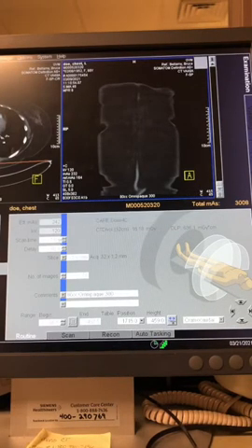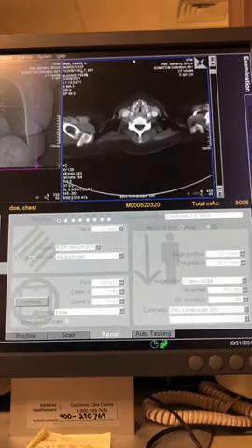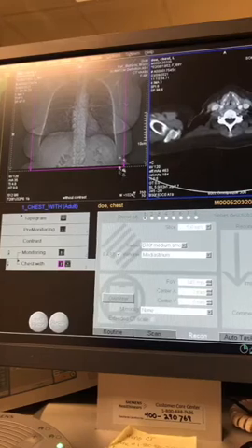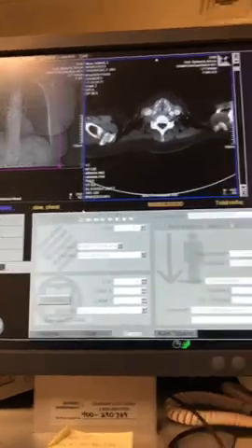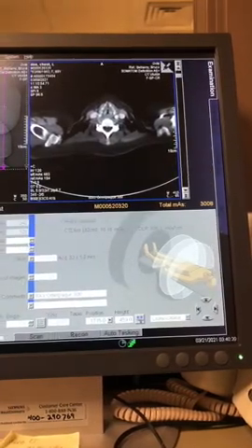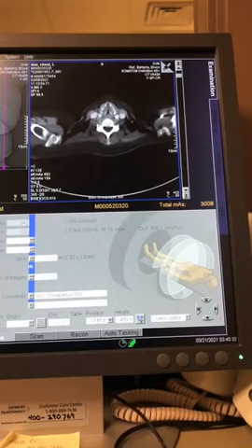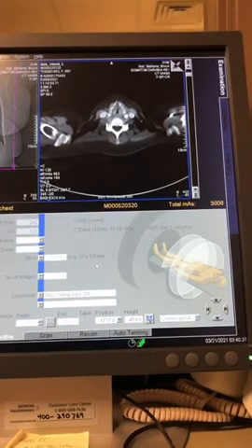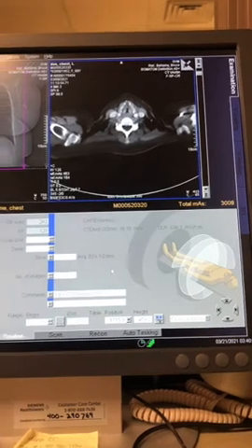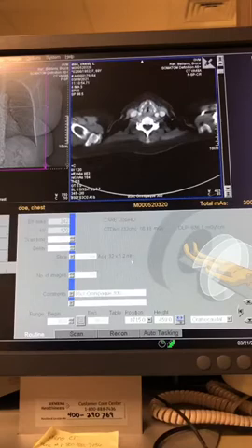So the scan time is going to be based on the range that we set up initially. Okay, so this range over here, that's how many slices we're going to acquire, and that's what our scan time came out to 7.8 seconds. If we look here at the slice, you'll see that this is using 1.2 millimeter detectors. And they're using 32 of them, which is going to give us like our z-axis coverage for this scan. That's going to affect dose. You guys should probably understand that by now. If you don't, make sure you ask me.